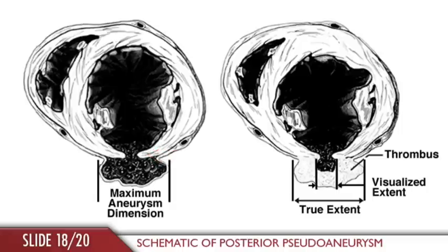Because the pseudoaneurysm cavity may be partially filled with thrombus, its true extent may be difficult to ascertain with echocardiography, and is often underestimated, as only the residual fluid-filled cavity is easily seen.